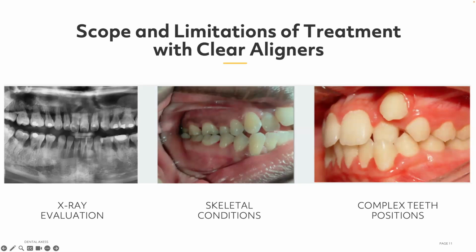First, we move the teeth and open the space for that canine, but we will need to use an external device like a button and elastic to bring that canine into the arch shape. And when we have it, the aligner can cover it and move it. So that's going to be phase 2.